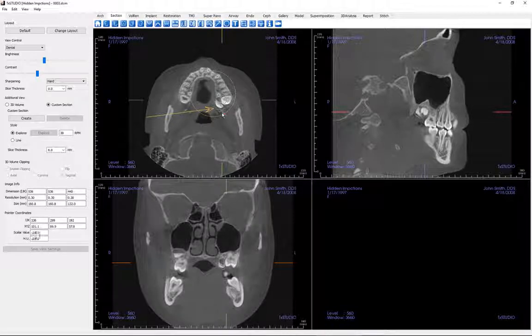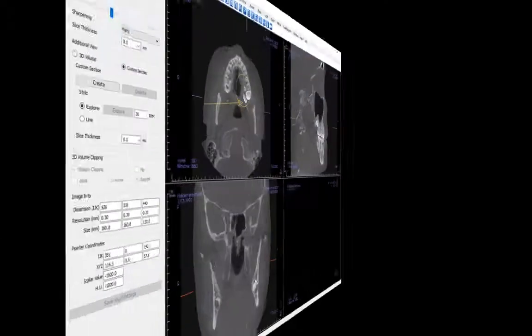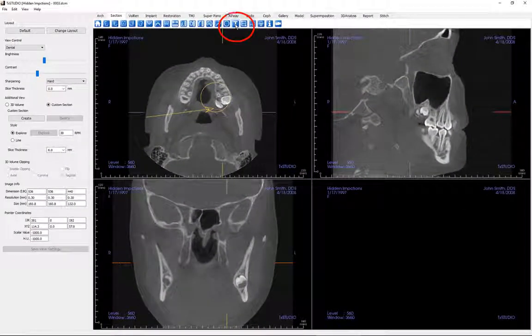The text notation tool allows text to be written and edited on the image. Click on the tool, then click on the image where you want the text to appear. While the inner text is highlighted, begin typing your message. After you finish, left mouse click somewhere outside of the text in the viewing window to lock the text in. You can left mouse click on it and drag it around the window.